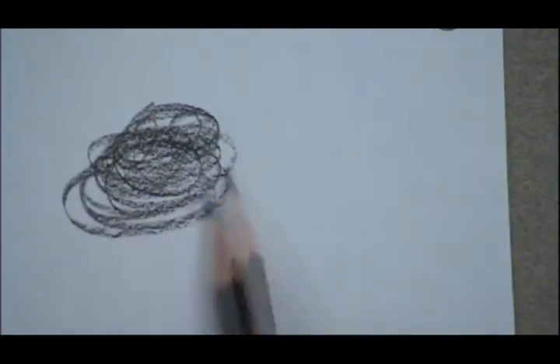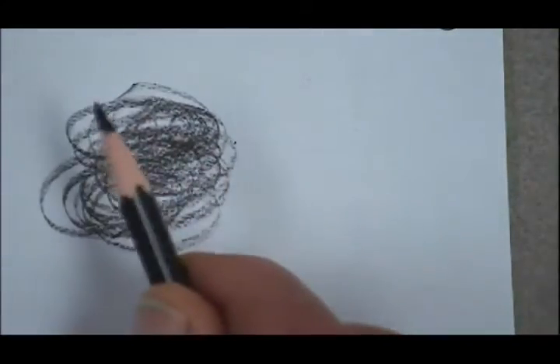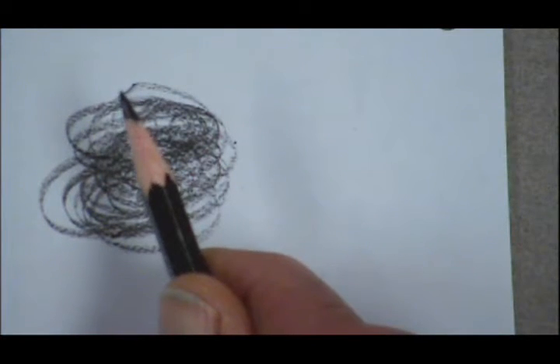One of the secrets I'm going to show you after all my years of coloring experience is to get your pencils really nice and sharp. After you sharpen them in a pencil sharpener, or while you're using them, take a piece of paper and roll the pencil around as you move it. It'll give it a nice sharp point.